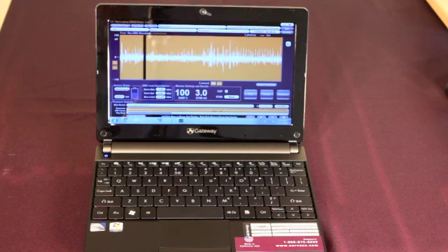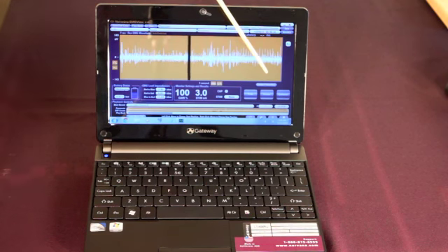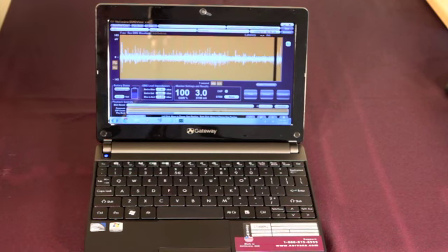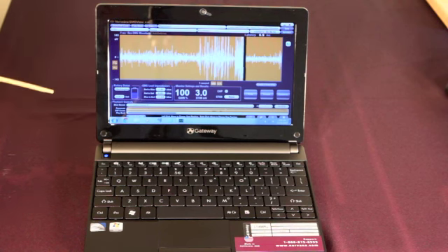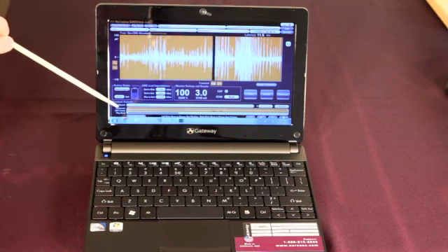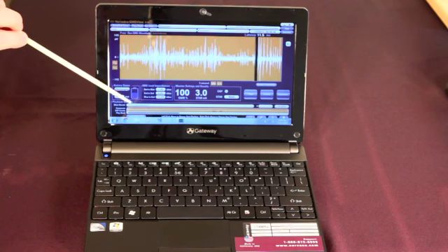What I mean by that is if the user had pressed the comment button while recording and typed a comment into EMGView, that comment was saved. And at the point in the playback file when that comment is added in time, it will appear here in the Most Recent comment bar.